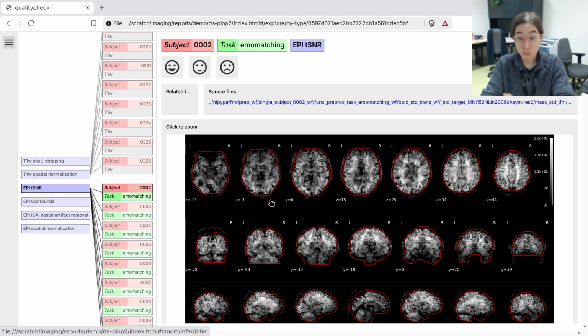Of course, not perfectly homogeneous because we have a biological system that is noisy. But we also don't expect there to be artifacts. And the manual outlines a bunch of those. That could be, for example, stripes or parts that are completely dark or far too bright, which may indicate a problem in the scanner, either software or hardware, that makes the data unusable.